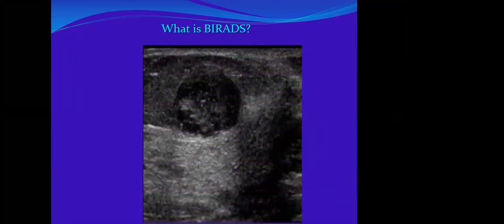And this is the lesion here on ultrasound. It is heterogeneous, hyper and hypoechoic, circumscribed but rounded. It went for biopsy, and it was a fibroadenoma. It's 4A, and it was a fibroadenoma that was revealed.